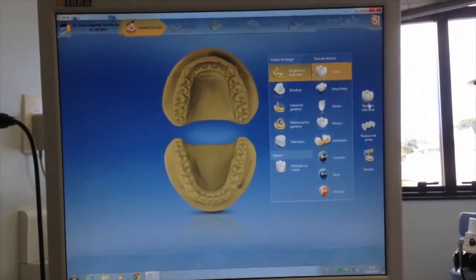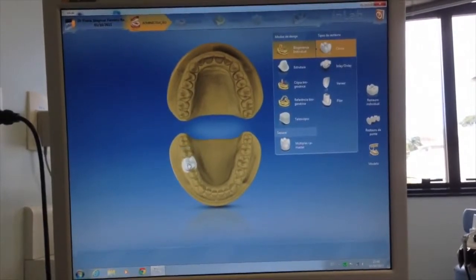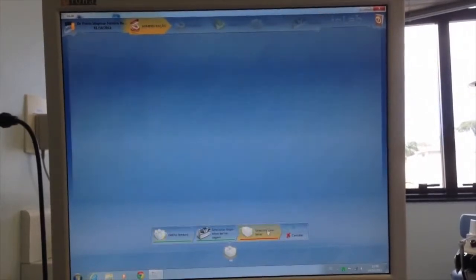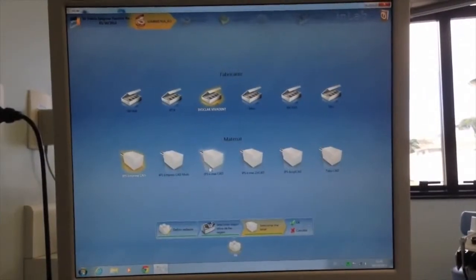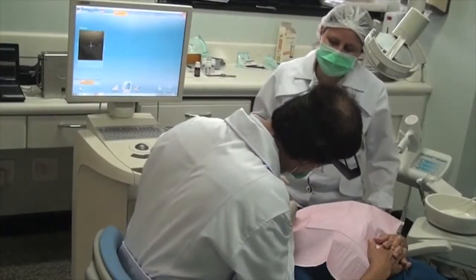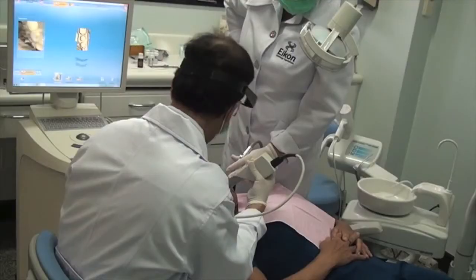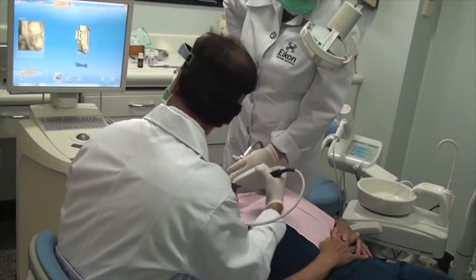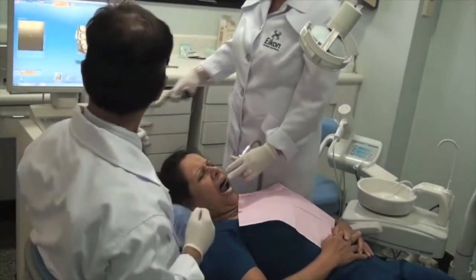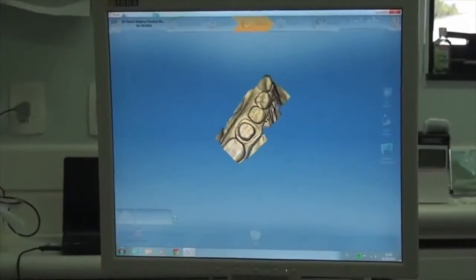The clinical situation was reported to the administrative part of Sirona InLab 4.0 software, and the sequence passed to digital impression or scanning of the case. The models were generated.